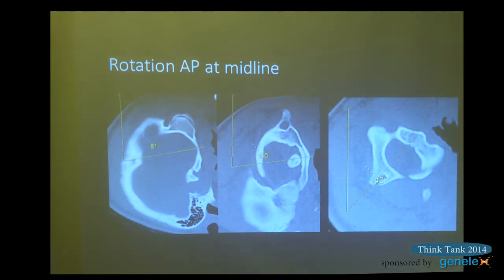And these are measurements that I would be doing in an axis perpendicular to the anterior-posterior dimension for the vertebral body. I'm measuring about 80 degrees, and this at a perpendicular is about 40 degrees, 42 degrees. And much of the time it's a complex position as opposed to simply being turned. People tend to move a little to the right, a little bit forward, or a little bit back. So there's some estimation about this. But this is an approximation for a recognized clinical problem.